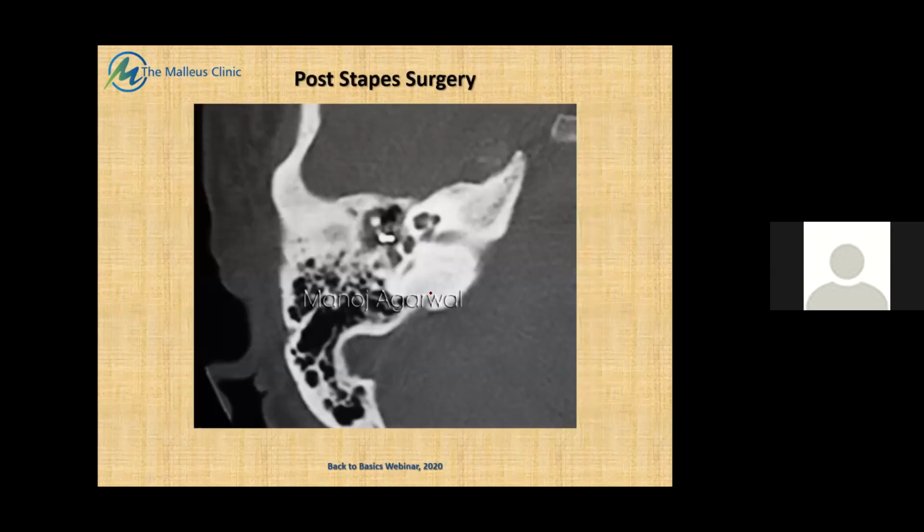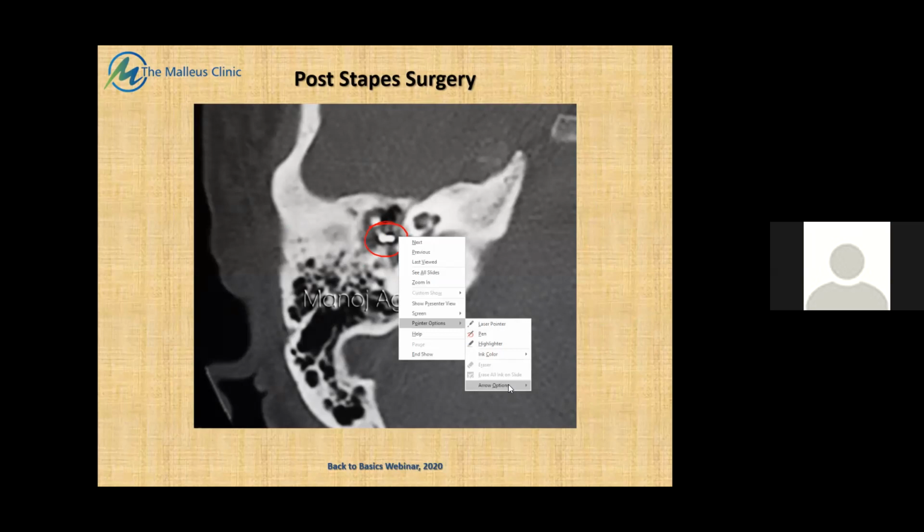From accidental injury, we move to the surgical injury, and that is post-stapes surgery. Now, you might not always be fortunate enough to have your stapes illuminated like that, for the simple reason that it all depends upon what. Just a moment, please.